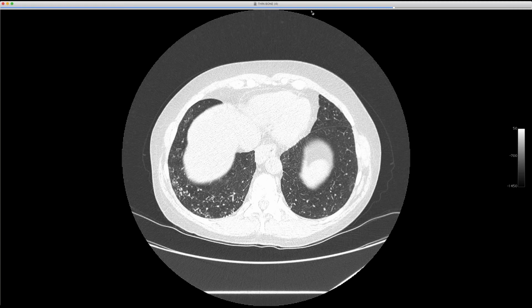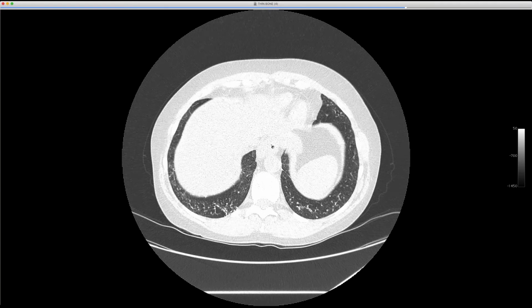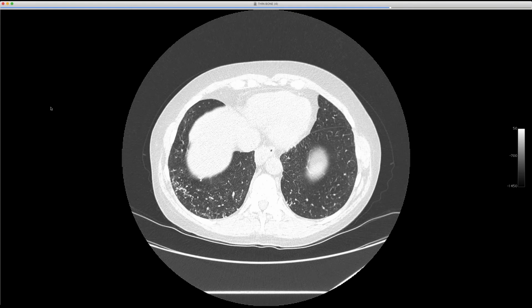I don't know whether it's a protective mechanism or what, but just something to think about as we see this. I can't prove he aspirates, but it sure fits the distribution. It's got a hiatal hernia that would promote aspiration. Yeah, although those are as common as hypertension, it seems like.